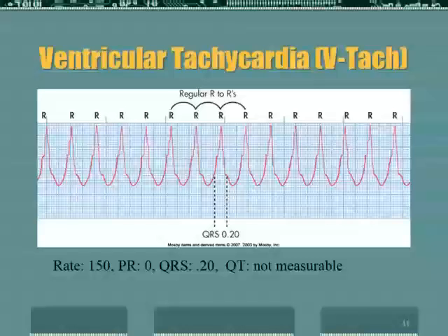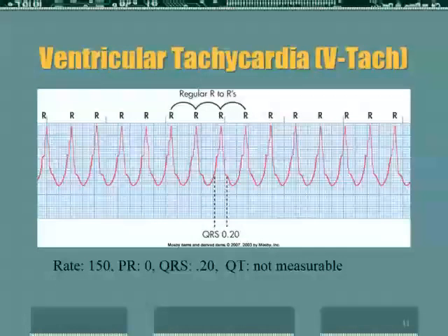It's very important when you see abnormal rhythms on patients to always treat the patient first and treat the monitor second, because especially with PVCs, sometimes there's PVC with a pulse, and there's VTAC with a pulse, and there's VTAC without a pulse. So sometimes you might see this on your monitor, and you might go into the patient's room and find that patient conscious and alert, but with a poor cardiac output and a poor blood pressure. Sometimes you might go in and find that patient completely unresponsive, not breathing, and no pulse whatsoever. So look at the patient before you treat the monitor.